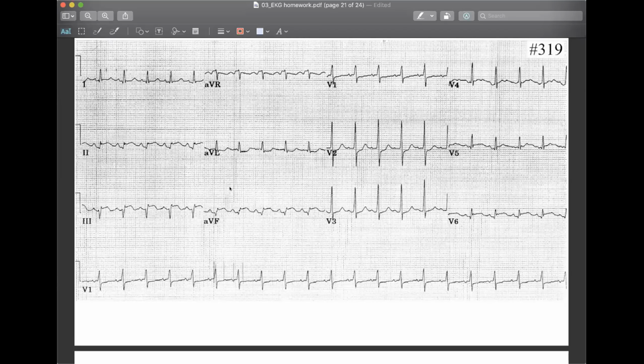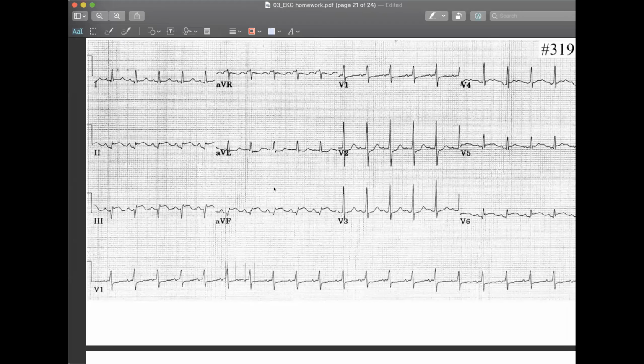And if you do have an acute inferior MI, you should look at the posterior. Can you see any sign of the posterior? That's one of the posterior leads again. V1, V2, okay. That very tall R wave. The R wave is so big.